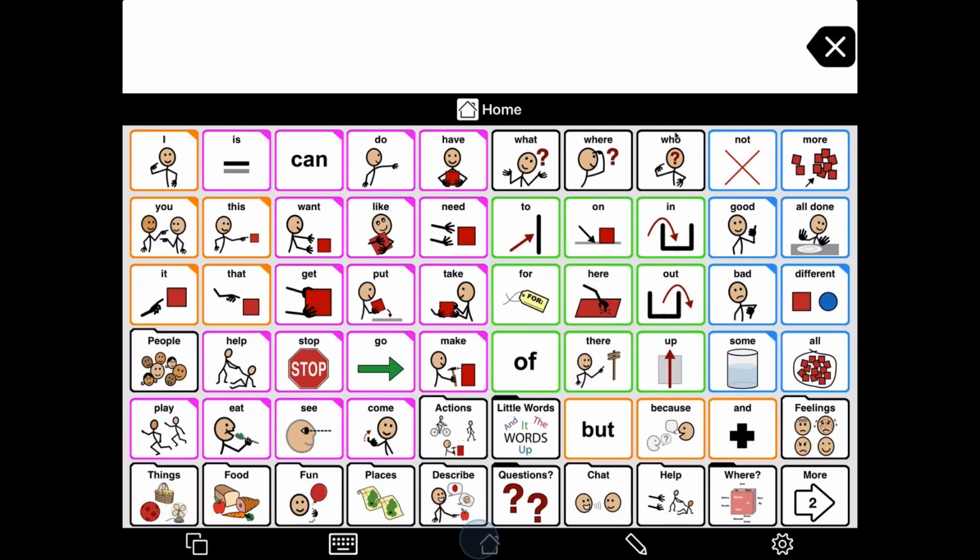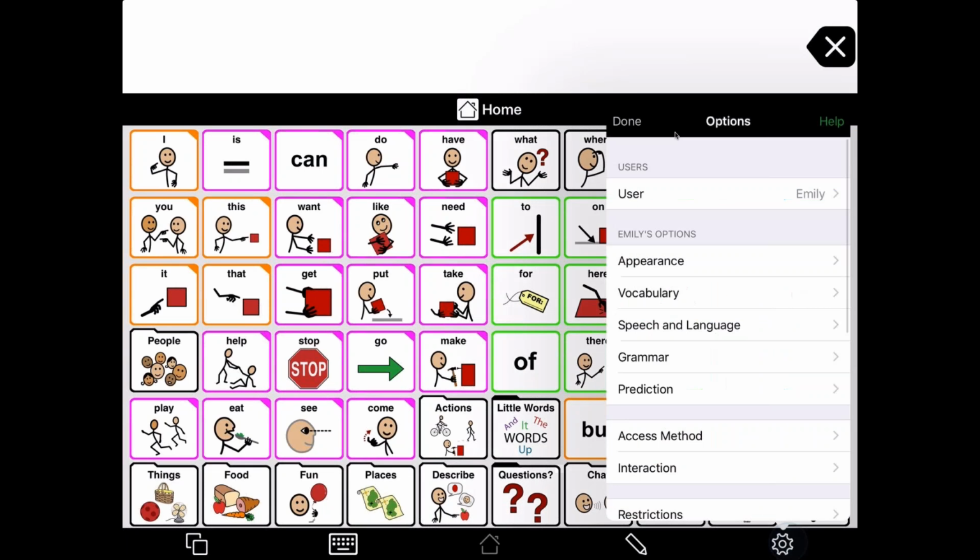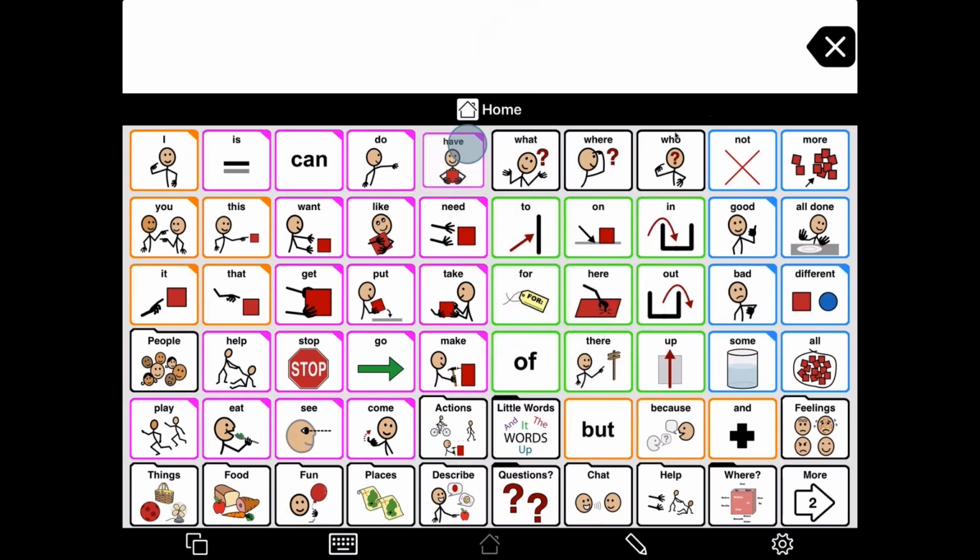Okay, we talked about the inflections. I'm just looking at my notes here. So what we're going to do now is I'm going to fulfill my promise and tell you how to copy things between those 2 users that you might have. So if you had Proloquo2Go before 4.0, before Crescendo came out, that was April of 2015, then what you should find when you update to Proloquo2Go 4 is your old user should be in place. You shouldn't really notice any difference except for these filled-in corners for the inflections.